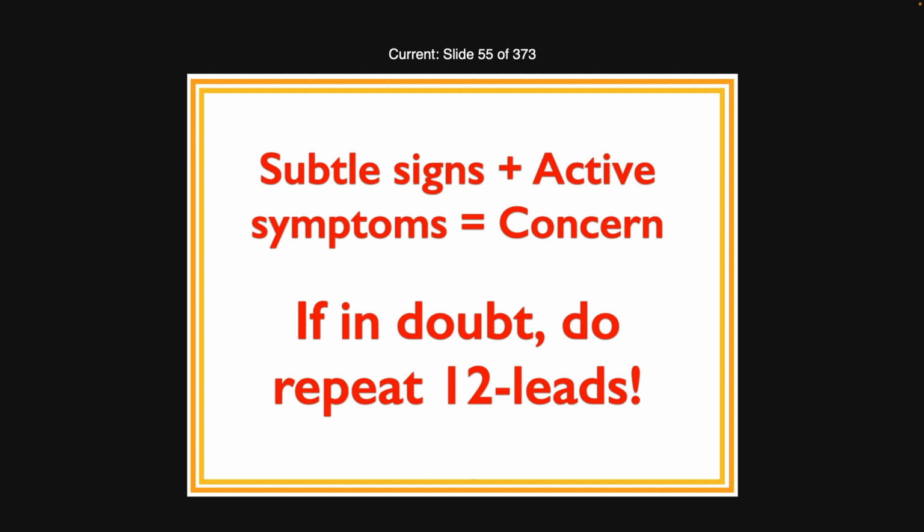Matu said that whoever was looking at it said, oh, there's no problem because the T waves are concave upwards. And that is a sort of a thing, because generally speaking, if your T waves look like that instead of straight or convex, it's a better sign. People will say concave upwards, that's like a smiley face, it's good. But that being said, there are plenty of STEMIs where the T waves are concave upwards, so it's not a definitive thing. But that's what that term means, the T wave ST segment swoops upwards.